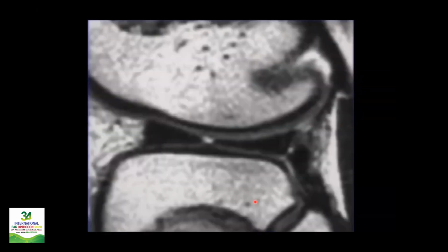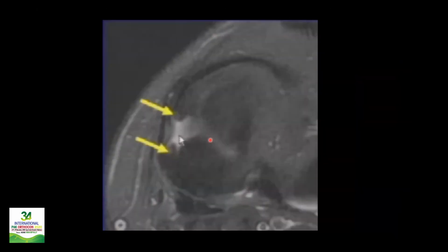This is another case, and you can again appreciate that there is an abrupt tapering of this part of the meniscus. This is relatively smooth, but this is going to be abruptly cut off, and then you can see a defect in this case as well. This is an axial section, like you are cutting through the defect, and this is the meniscus running from anterior to posterior, and you can see a defect which is running all the way to the periphery. Through this defect some fluid is communicating.